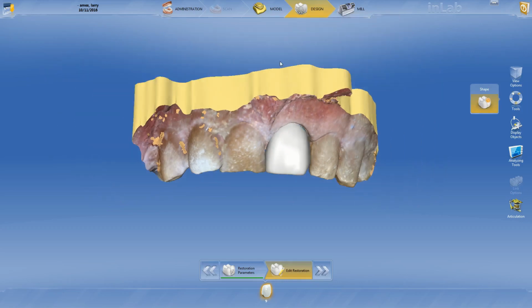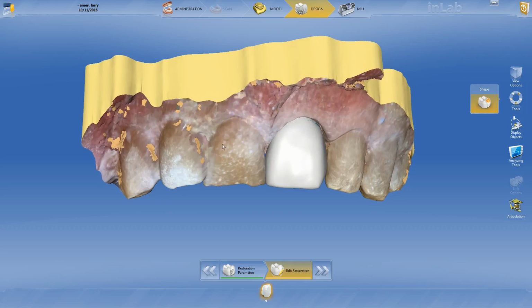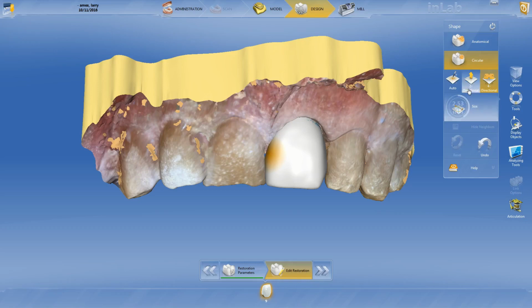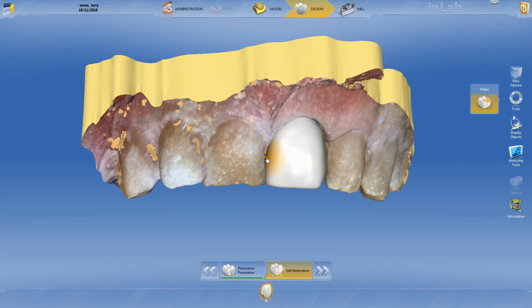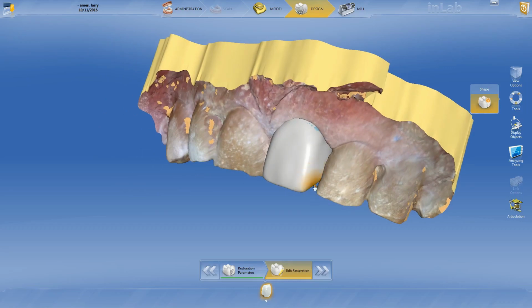I really hope that this is helpful. If you're still having an issue with it not looking symmetric in terms of width, and your patient is opposed to adding composite to the other side, for example, then one thing you could do is add a darker stain in this region, and that will mask it even more. If the first technique doesn't work, bringing it back lingually.